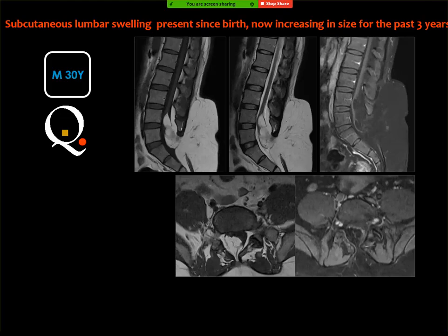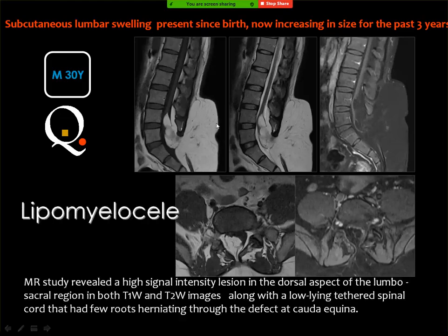Lipomyelocele. Sometimes I mentioned in relatively old lectures that this is a lipomeningomyelocele, but actually you do not have a meningocele here. You have a big lipoma, or a big fatty mass, that is continuous both inside the spinal canal and outside the spinal canal. This fatty mass is bright in T1 and T2, and dark in the fat suppressed images.